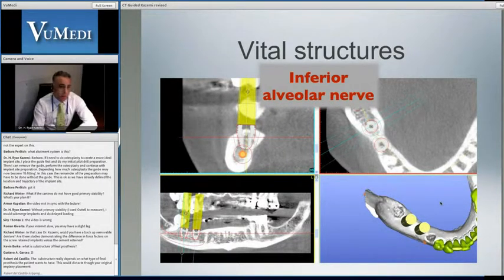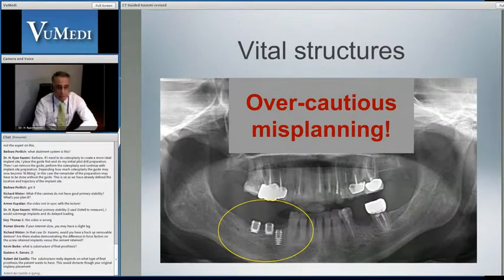So we have to think about what type of implant can be used here. And we choose a wide and a short implant since we have plenty of width. This was an implant that's 7 millimeters in length and 7 millimeters in width. And you can see that it's crucial that we position the implant with maybe just half a millimeter or a millimeter away from the canal. So this information is crucial to be able to provide this treatment safely and avoid any nerve injuries.